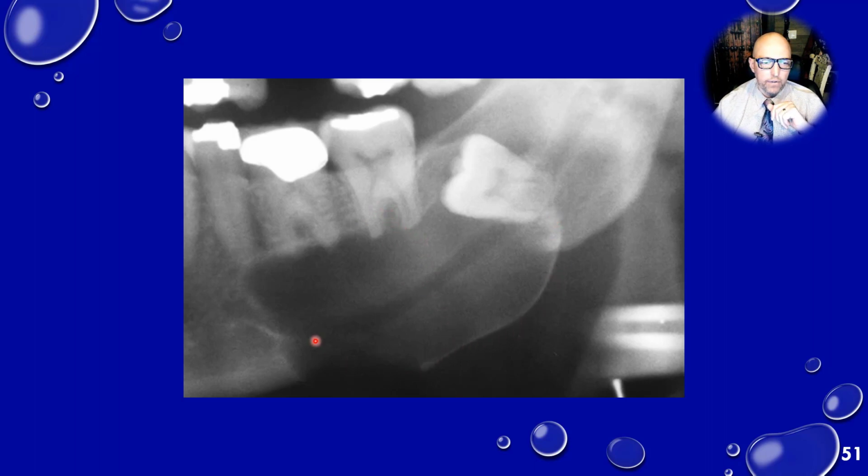It's expanding inferiorly. Is there a little bit of scalloping? Is there a little bit of root resorption? Now, I didn't mention the internal structure. It's obviously, I think, completely radiolucent, so I don't see any other internal pattern to describe. Effect on other structures though, resorbing the roots of these teeth, expanding, which we already mentioned. Displacement of the canal? Not really. It follows the same path there.